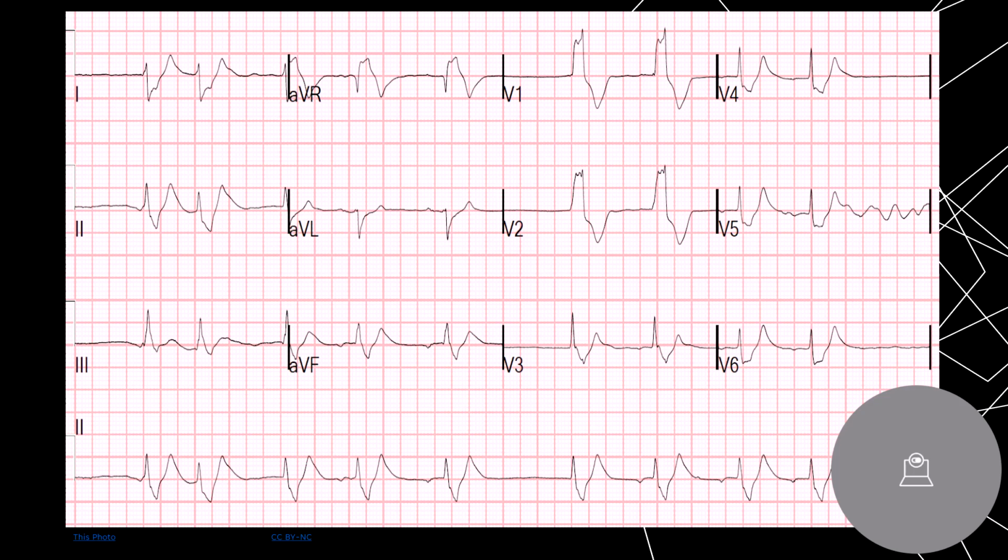We're just going to look at this one, and I'm going to go, okay, this is QRS, T-wave. It's actually pretty level, guys. Pretty level. Okay. These can be tricky because this is a right bundle branch block, and they get into RSR waves and R primes, so this is probably not depressed. It just presents that way. But again, I'm not going to get into this today.